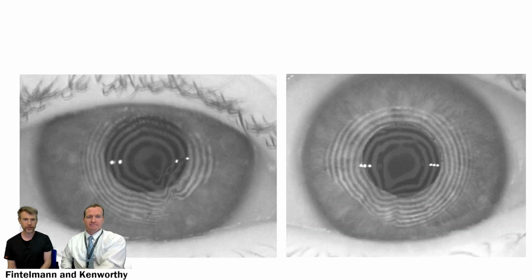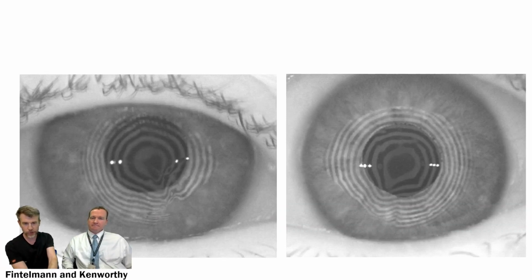We live in one of the states where RK is very popular, and because we have a large retirement community, also very prevalent. But there's not a week that goes by when I don't see RK. RK causes a multitude of problems. I like Placido discs for illustrating some of them.